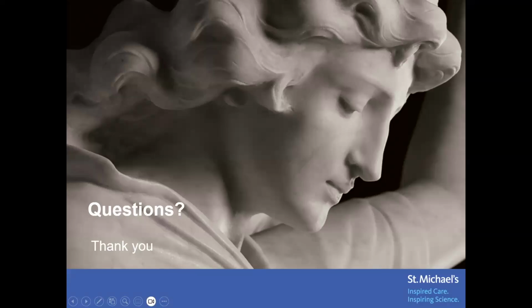My question about the ejection time is this. We have the profile already, so measuring is not difficult. Do you know if this is actually in our system that you can measure it, or have we programmed it in? I don't think it's in our system. But it's something that we can just do when we're reporting it, just to check the ejection time.